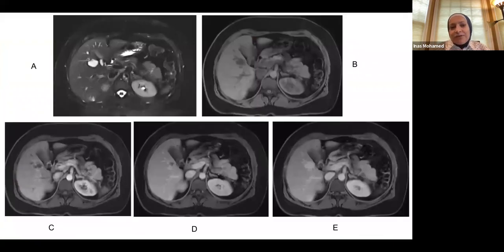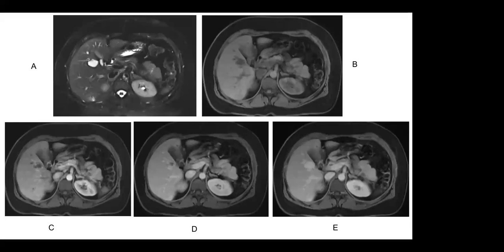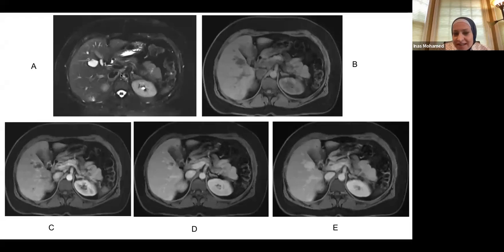So this is actually our first case here. I'm going to be nice and just tell you what the sequences are. This one here is a T2 weighted image. As we see, the spinal fluid is bright. This is the lesion we are looking at. This is T2 fat saturated, the fat is dark here. And this is T1 pre-contrast, the same lesion. And here, this is what we call a late arterial phase.